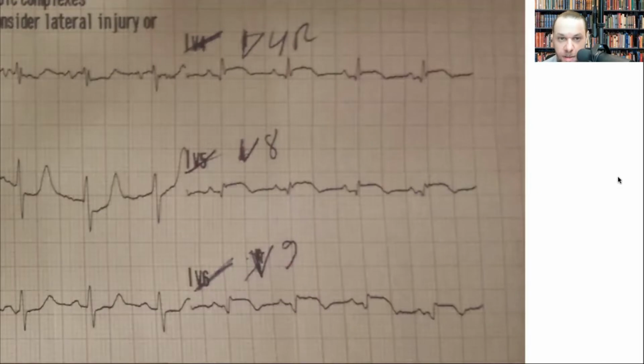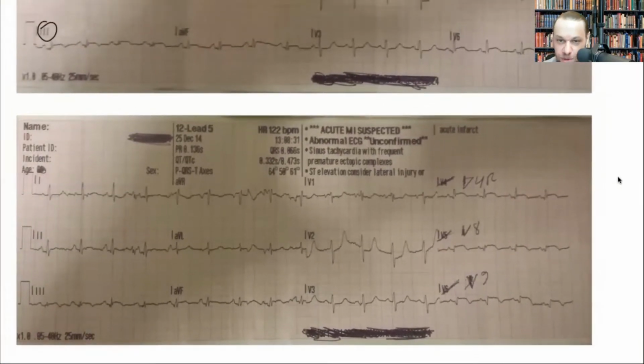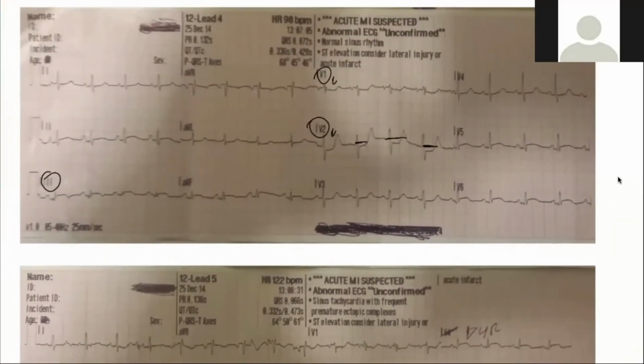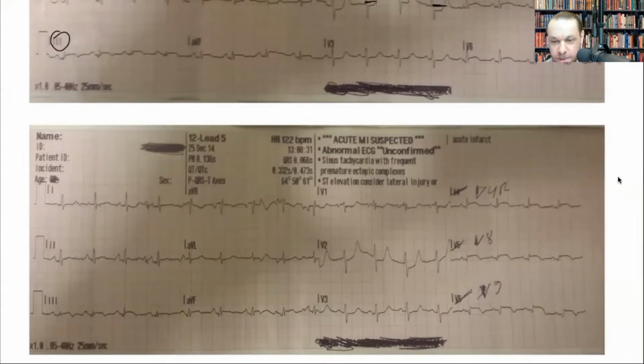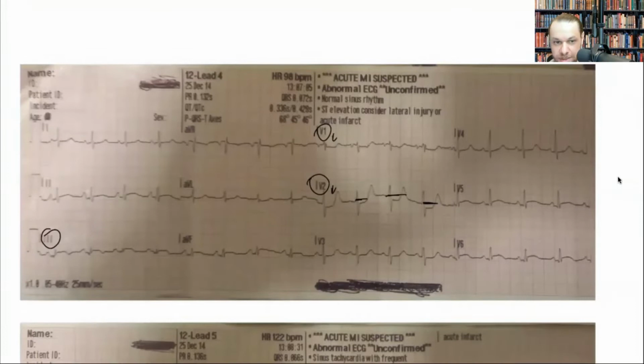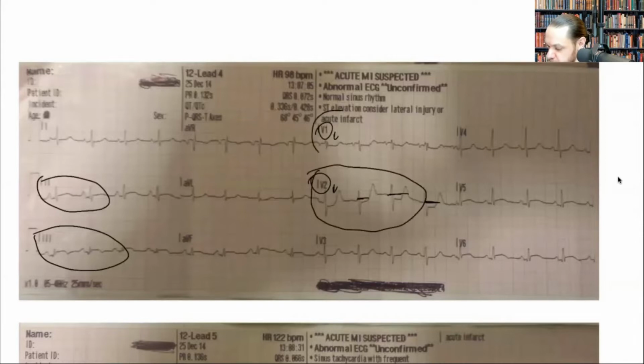If you look here, right, for this particular case, what medication do you certainly want to avoid? Nitro, right? Nitrates. And one thing you want to be cognizant of, right? Sometimes you come in, you may have an EKG that doesn't scream at you, like you have very big ST segment elevations, right? They look kind of subtle, right? But your eye starts to catch these depressions, right? So do the 15 lead EKG, right?